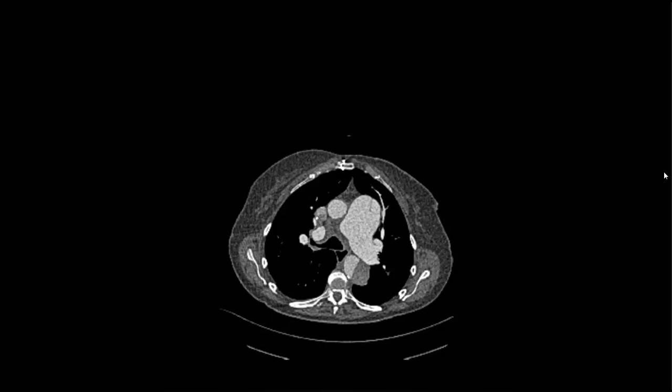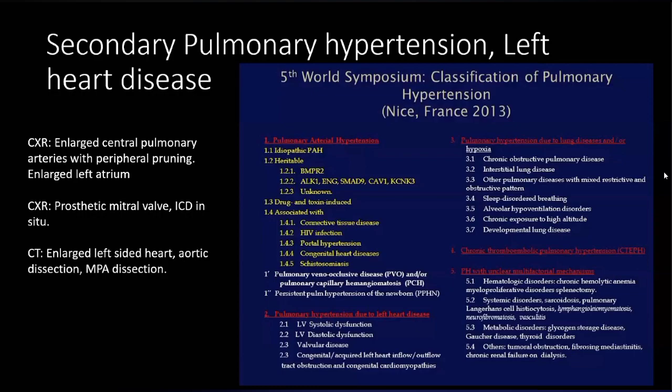But what do you think about what's happening right now? You said it's a pulmonary hypertension, right? Can you go over which class of pulmonary hypertension it is? Because it's not an idiopathic pulmonary hypertension. Five types. Class 2 was due to left heart disease, and class 3 was due to lung diseases, which we always see. Okay, thank you very much. Very good.